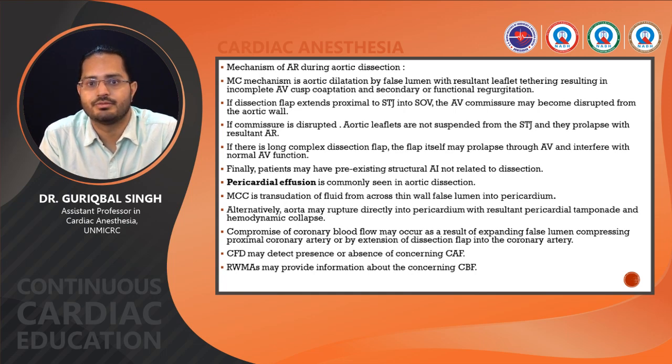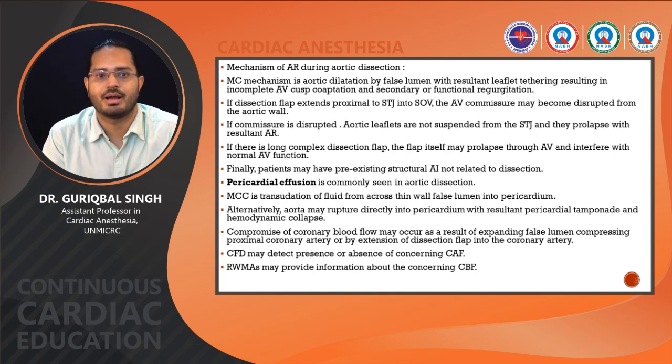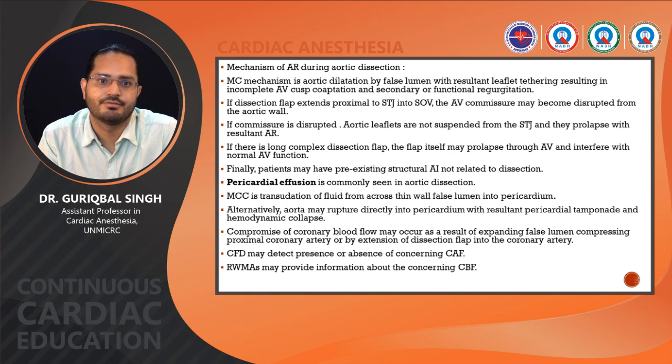Compromise of coronary blood flow may result as a result of expanding false lumen, which can compress proximal coronary artery or by extension of dissection flap. Color flow Doppler may detect presence or absence of coronary flow, and RWMAs may provide information about the coronary perfusion.